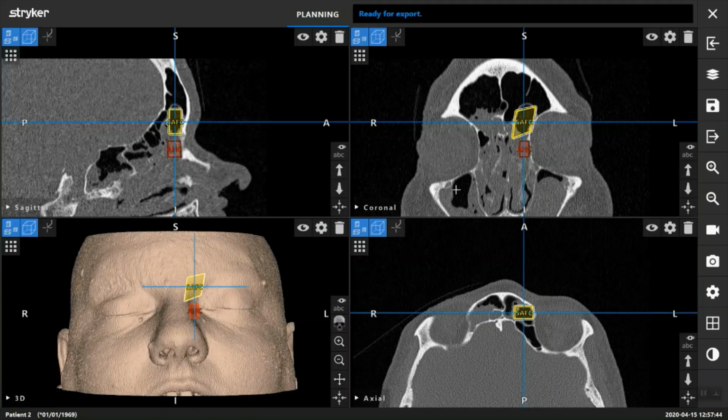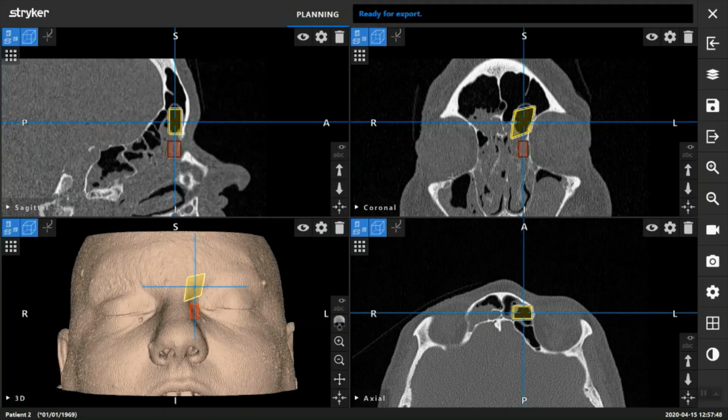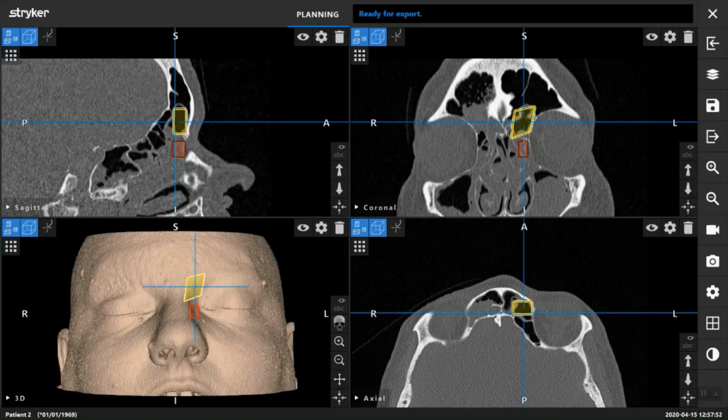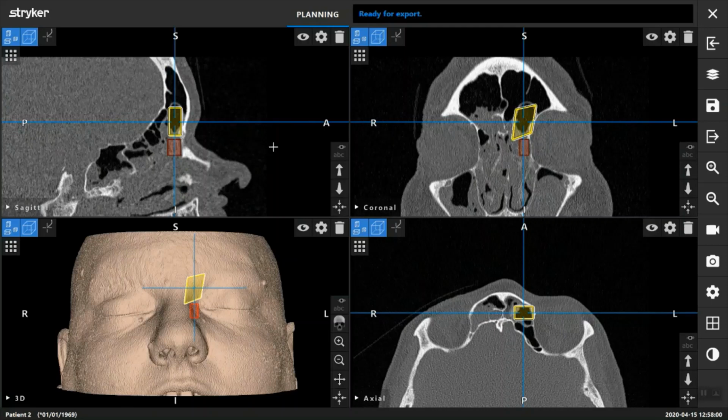Then as we look posteriorly here, I'm going to get rid of the labels for just a second so that we can go posteriorly, and we're kind of correlating that with what's going on over here. And we say, well, maybe when we drew this, I should have pulled that down just a little bit more.